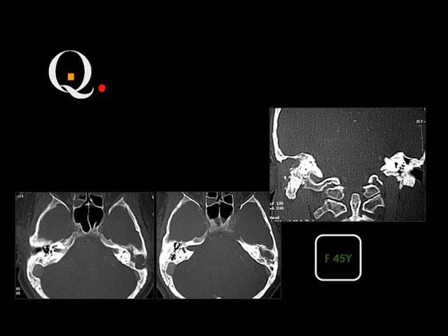What do you mean, external cholesteatoma? Okay, if you look here, this is the middle ear cavity, and this is the mastoid air cells, and these are the ossicles, the picture is a little small, and the lesion is destroying the mastoid antrum and extending into the middle ear cavity, and this is cholesteatoma, acquired cholesteatoma.